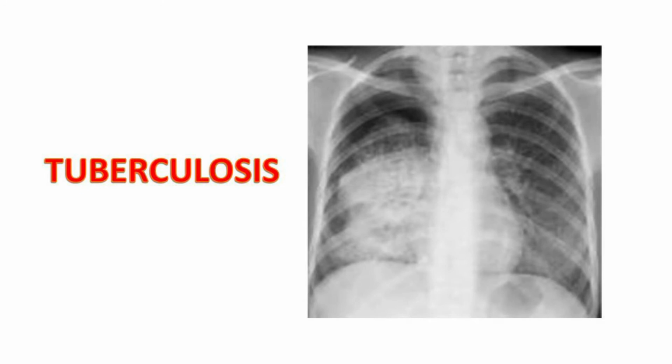This is the tuberculosis of the lungs. It is one of the serious infectious diseases in lungs caused due to bacteria called Mycobacterium tuberculosis. It may be spread from one person to another through tiny droplets released into air via cough and sneeze. This is also a communicable disease. Here we are seeing clearly that right side of the lower lungs are completely damaged.